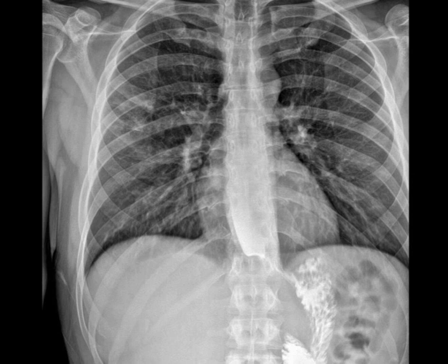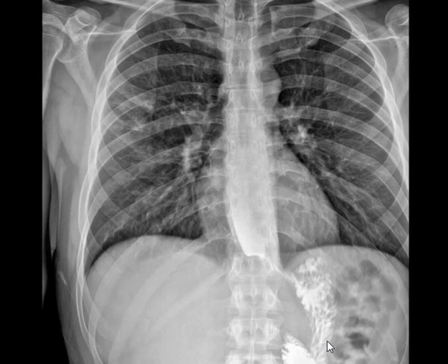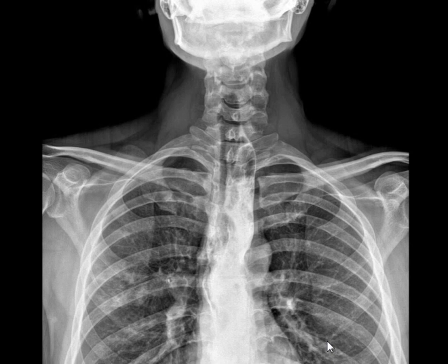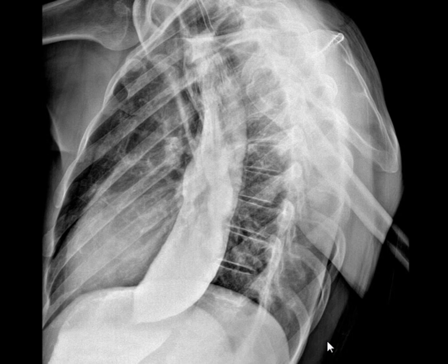So what do we have here? Go another, maybe, no. Up. Okay, another one. And another one. Stop. What do we have here? There is an obstruction here. There is a narrowing. Okay. A narrowing here. What do you call that? Gastroesophageal. Gastroesophageal what? Junction. Gastroesophageal junction appeared narrow. So why do you think is that?